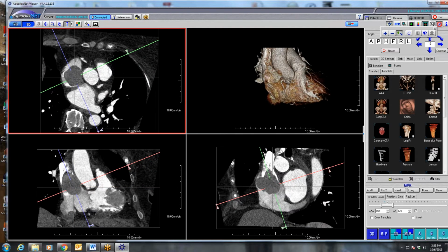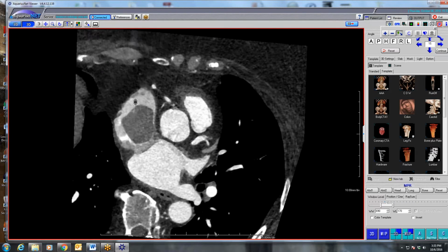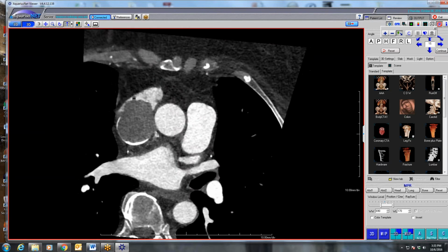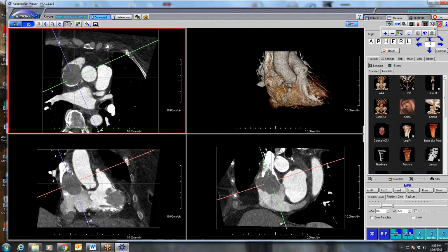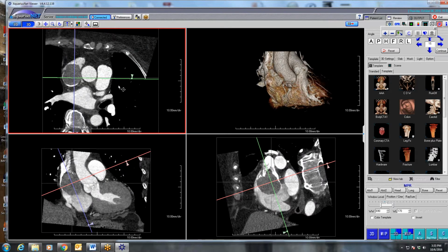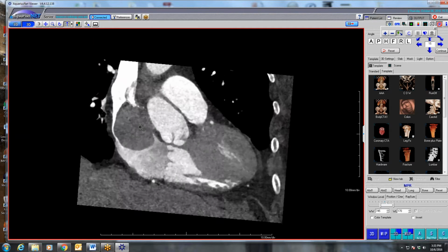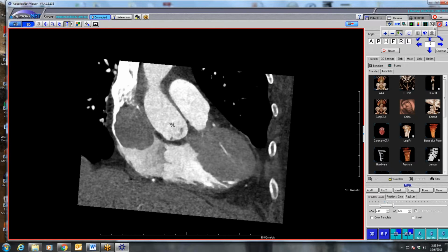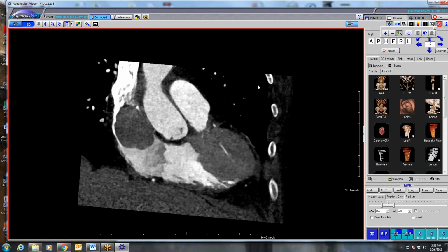So for some reason, we got an MRI on this as well, which doesn't really show any difference from what we expect with the lesion. Actually, final path is yet to be back. I should hold my tongue, but I can't imagine this being anything else but a myxoma. But yeah, so this is another right atrial / SVC-ish myxoma.